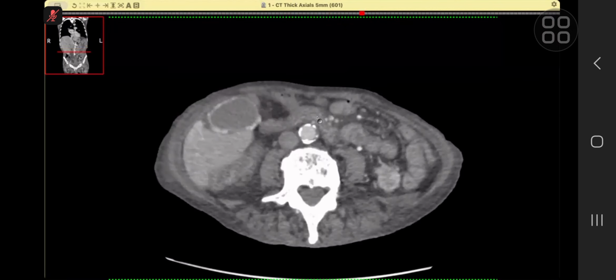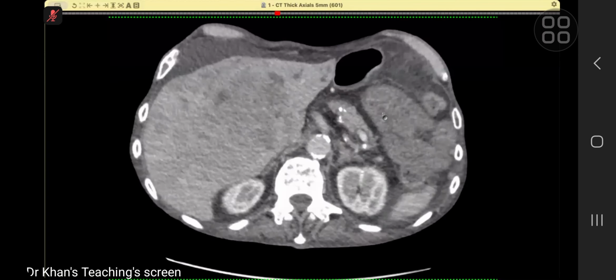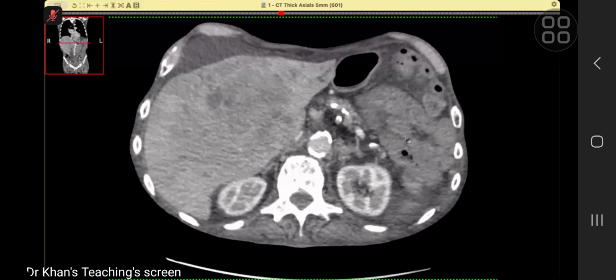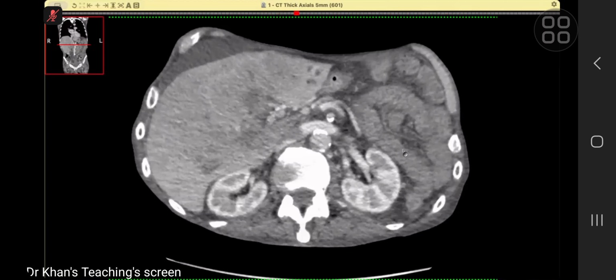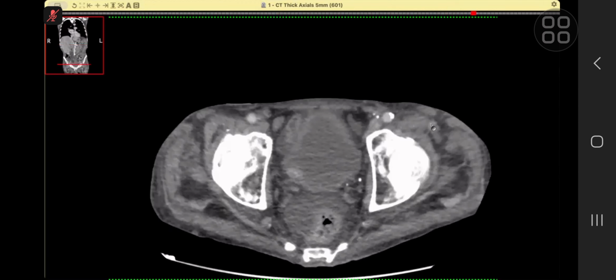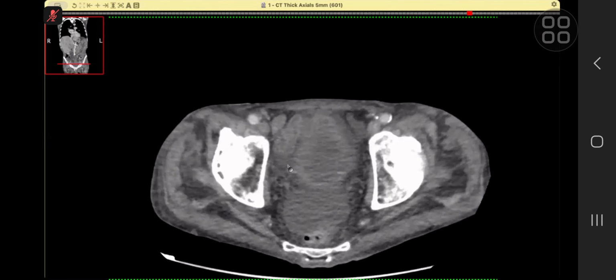calcification there. We know that porcelain gallbladder is associated with malignancy. It's just an academic exercise here in this particular case. This adrenal, quite bulky, may be involved. This is the RCC. And then if you see the bladder, there is another lesion here. By the way, in this exam, people got a similar type of, in the long cases, UB, ureterovesical junction tumor. So this is a urinary bladder tumor also with ascites.